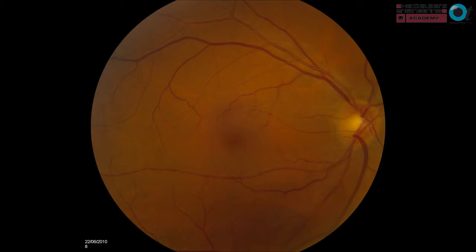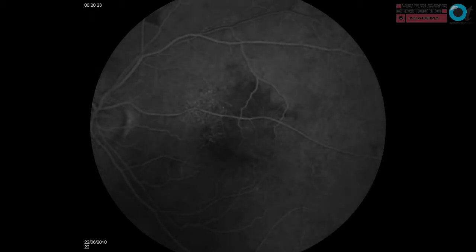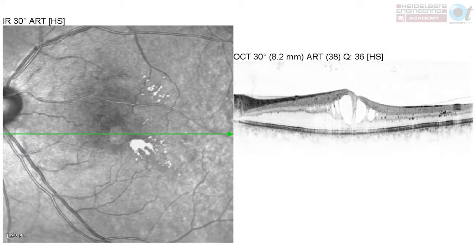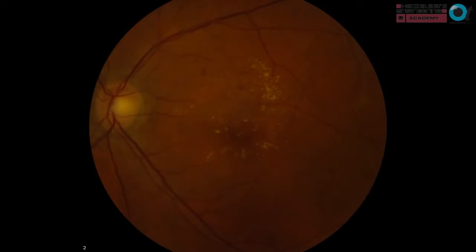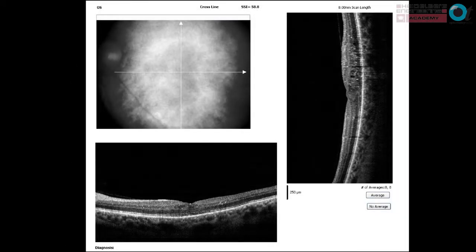He has a branch retinal vein occlusion, and if you look at his fluorescein, you can see an area of hyperfluorescence from those damaged capillaries secondary to the branch retinal vein occlusion. And that's what's causing his macular edema and macular swelling. The OCT again shows that beautifully, with loss of the foveal pit, with macular elevation and those hyporeflective cysts centrally. I treated him with laser with really good results, and again, if you look at the autofluorescence, you can see those burns with nice resolution of his edema and maintenance of that 6/12 vision in the long term. We also identified his blood pressure and his underlying hypercholesterolemia, which we've addressed.